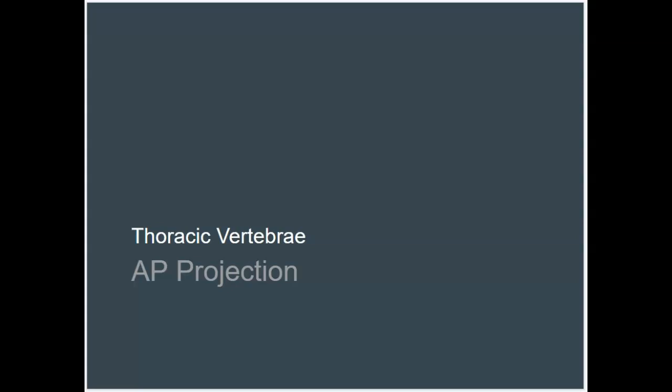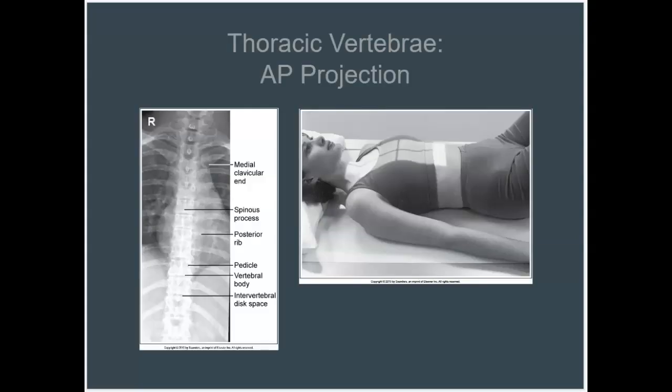Hello everyone. Today we're going to talk about T-spine projections. Let's review the image analysis guidelines.